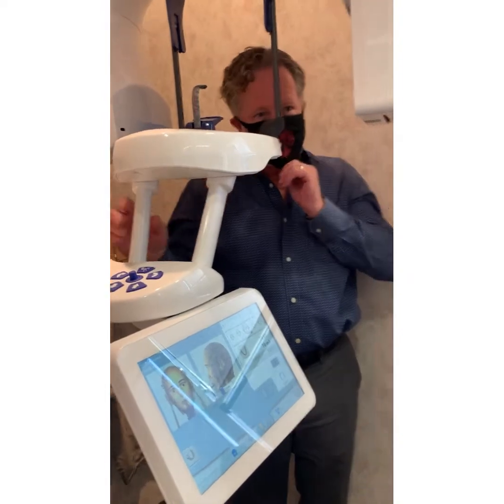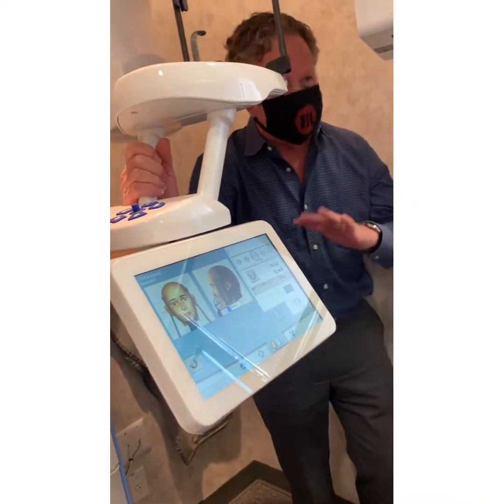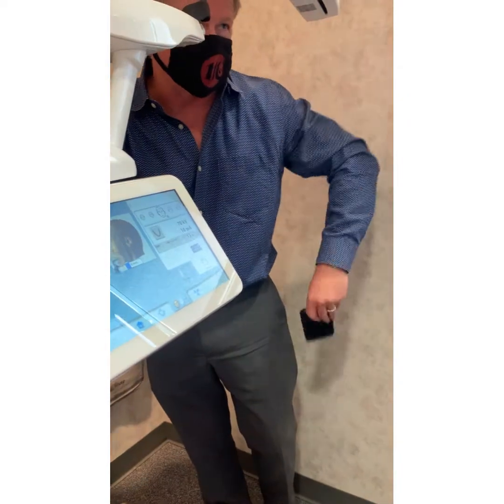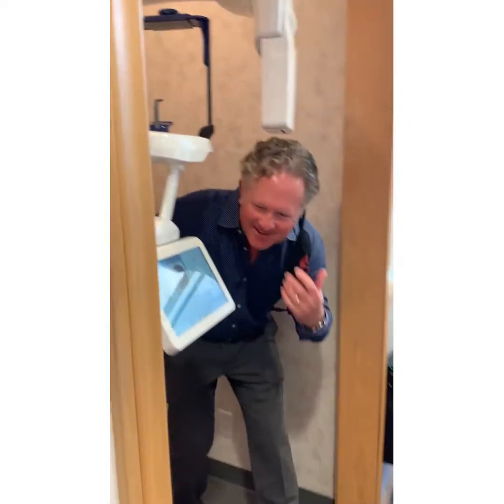Oh, yeah, not Mary. Any questions on the 2D part of this? Since you guys have all taken pans before, nothing's going to change. It's just the nuances of how to operate this. And they've made this over the years look more and more like this. We're all pretty good with these, right?